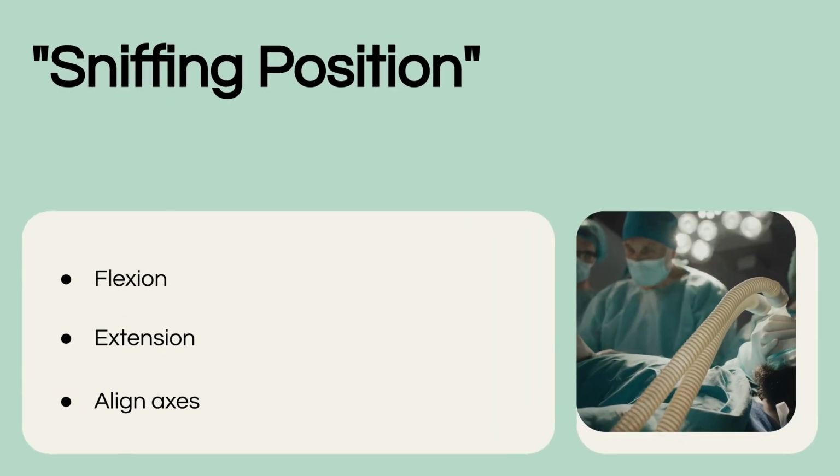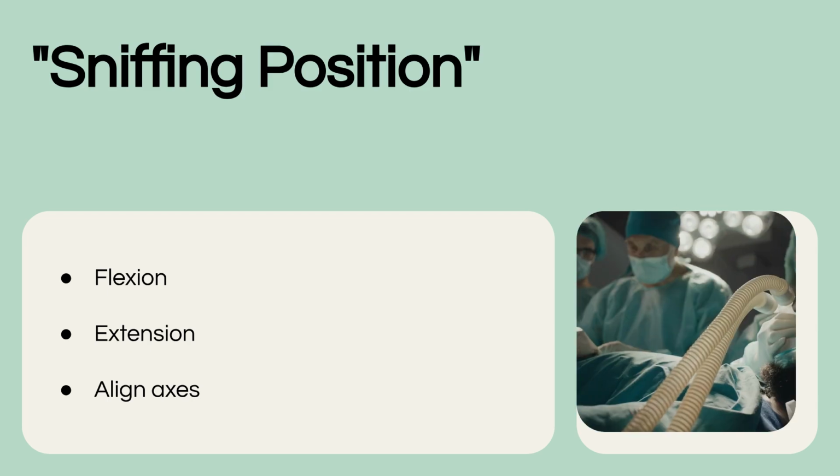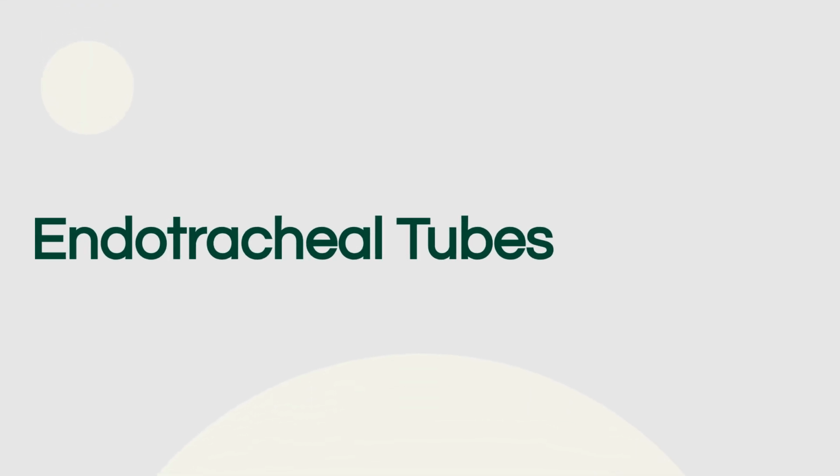To achieve the best view, position the patient in the sniffing position, involving lower neck flexion and head extension to align the oral, pharyngeal, and laryngeal axes. Finally, we discuss the endotracheal tube, or ETT, which conveys gases directly into the trachea.